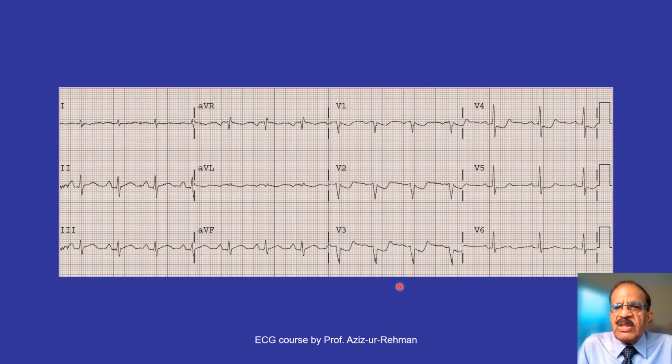This could represent ischemia of the anterior wall also. But in this case, most probably it indicates true posterior or posterior wall infarction, because the history is suggestive of infarction. Resting pain, which is prolonged pain, which is associated with diaphoresis, should suggest to you the diagnosis of actual infarction, not just anterior wall ischemia. ST depression in right-sided leads can also be seen in right ventricular infarction, but we don't see any findings of right ventricular infarction. If you go further, there is no ST segment depression or elevation.